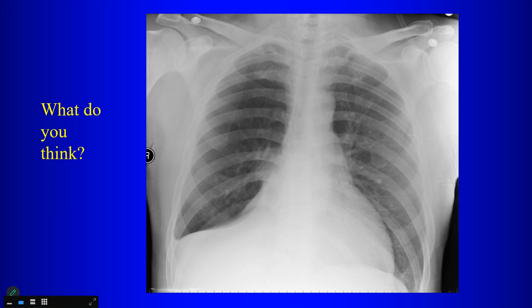Also, when you compare the right lung to the left lung, what do you notice? Hyperexpanded. Okay, so the right lung is more lucent than the left lung, and you interpret that as what? Hyperexpansion. Of? The right upper lobe. Yeah, so compensatory hyperinflation of the right upper lobe when we have collapse of the right middle lobe and the right lower lobe.